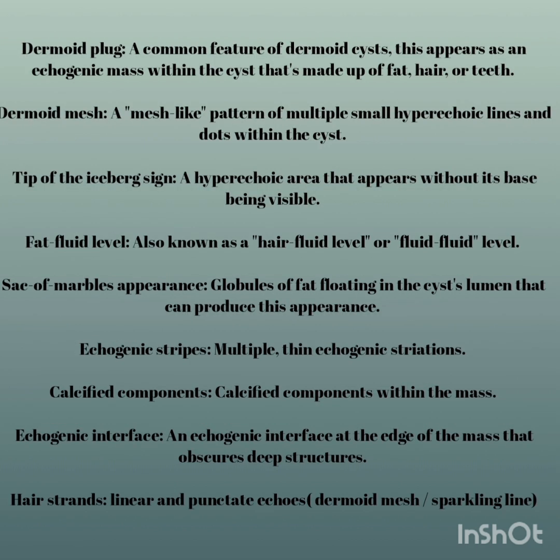There are certain characteristic ultrasound features of a dermoid cyst that help in its diagnosis. These include a dermoid plug. It is a common feature of dermoid cysts. This appears as an echogenic mass within the cyst that's made up of fat, hair, or teeth.